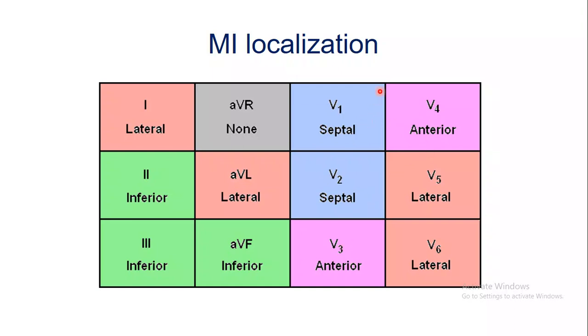After we diagnose ST segment elevation, we have to localize which wall is infarcted. If we have this elevation in 2 or more leads, this signifies that this wall is affected. V1 and V2 for the septum, V3 and V4 for the anterior wall, V5, V6, lead 1 and aVL from the limb leads for the lateral wall, and lead 2, 3 and aVF look at the inferior wall.